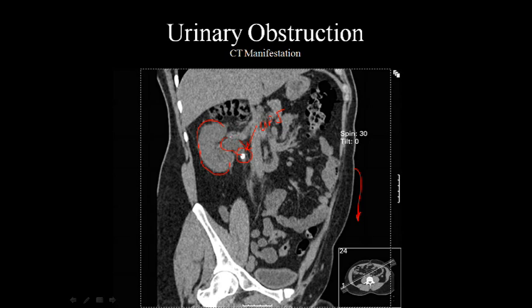Also, notice that we have dilation here. It's more prominent. I wish that we could see the other side so we could have a reference point, but take my word for it that the renal pelvis is slightly dilated.